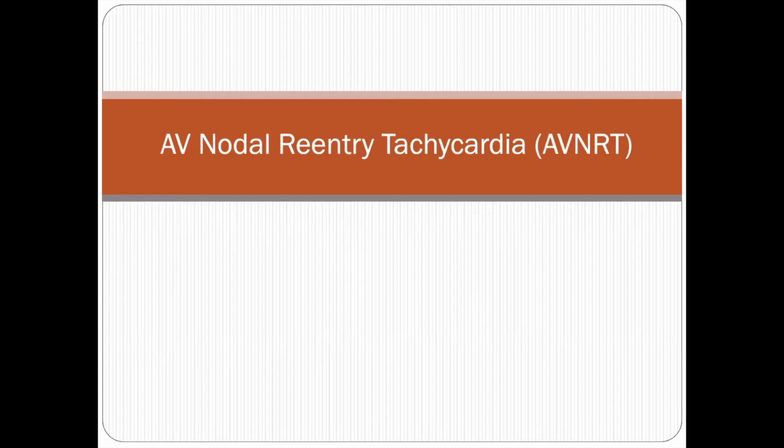And if the strip was never fast, and we did see some slower versions of that tachycardia in the patient at some previous time, then we might refer to it as junctional tachycardia. So the 130 to 140 range is a kind of gray area that we have to consider.